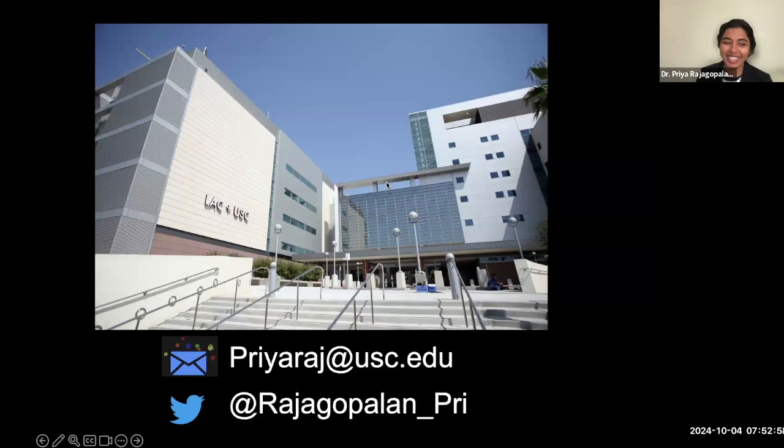So we have a multidisciplinary conference once a month at our institution, where we have the spine surgeons, radiation oncologists and neuropathologists all sitting in the conference. We all try to analyze what that tumor could be. For the patients that don't read their textbooks and present differently, we need everybody's heads together, and we're trying to figure out, oh gosh, could this be this? We think it's most likely an ependymoma, although it's not very classic. It doesn't have a hemosiderin cap or something like that.